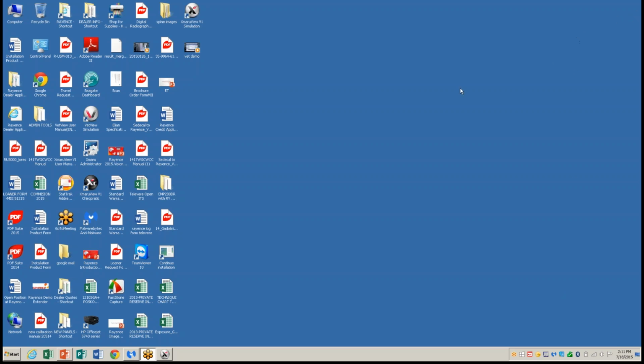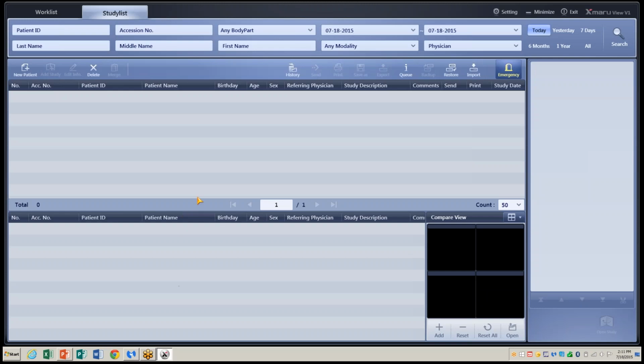I'm the Western Regional Sales Manager for Rayence, and I'd like to take a few moments to show you how simple it is to use the Rayence software.